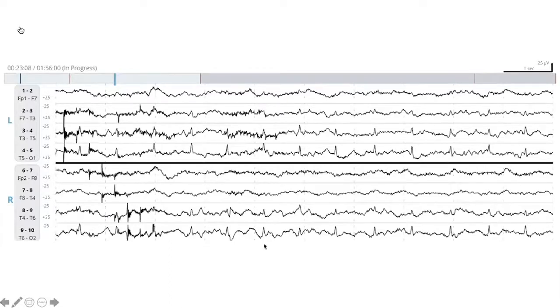Because if you had an EKG channel, you would see that every time you see these on the red line, you see the EKG also going up and down like this. I said earlier that one looks for similarity of the wave shape or waveform as a way of picking out which is epileptiform. And I said also the shape has that EKG feature. So going with what I said before, this should be an example of something that's epileptiform. And in some ways it can be misseen as that.